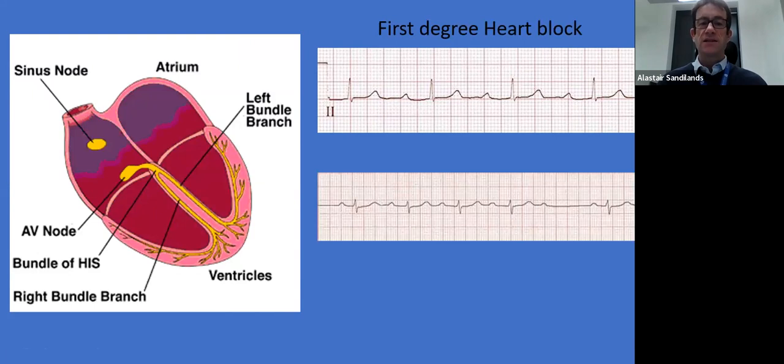Next, when the AV node gets a bit more stretched, particularly when there is high vagal tone, so some of us sleeping at night, there'll be evidence of this. So we clearly go across, there is the intermittent bradycardia, so it's not slow all the time. We do have an irregular rhythm. You look at the QRSs, but we have a PR interval that's slightly prolonged.